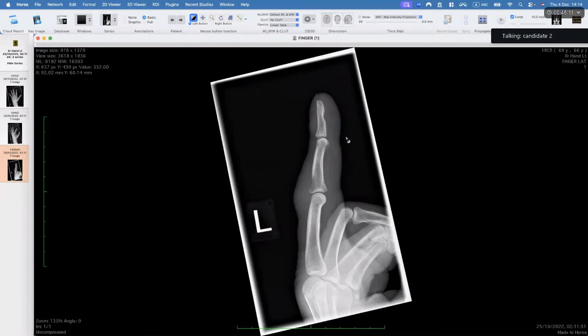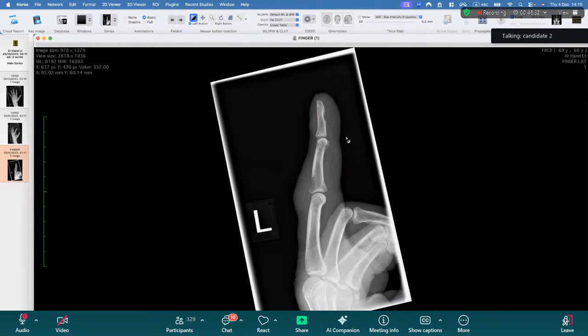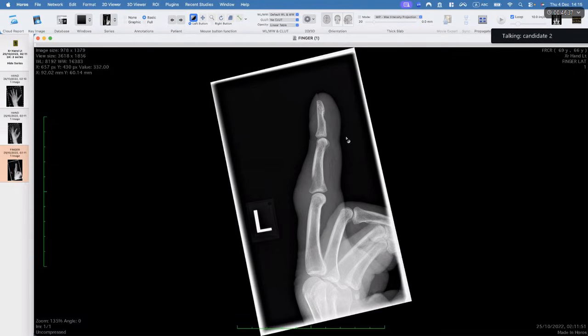So, I would be thinking in terms of giant cell tumor of the tendon, which, because it is long standing, can cause scalloping along the posterior aspect or mass effect over the bone along the dorsal aspect. Then, if the patient has any history of trauma, a chronic long-standing hematoma, but that is relatively less likely, or any cyst like epidermoid cyst implantation, which is present over a long period of time, can also cause this kind of appearance.